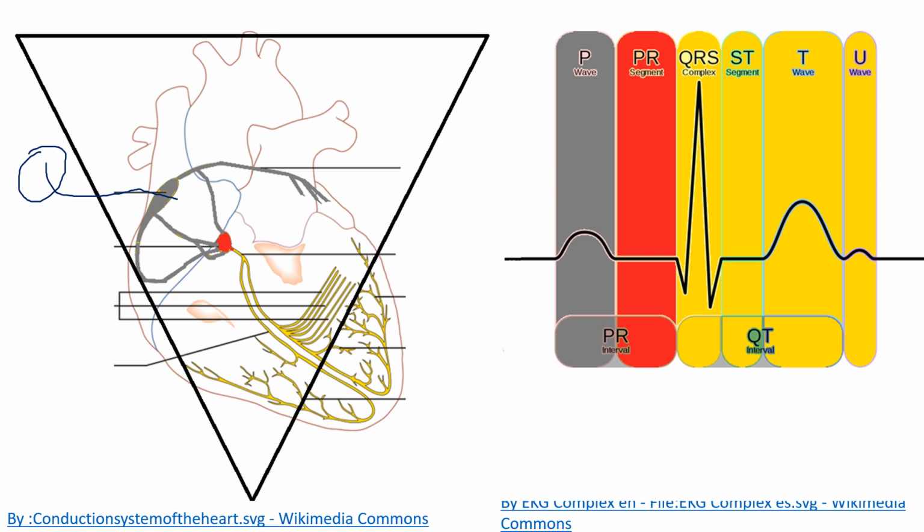Well, how do we know that you got a pacemaker? Well, we could look at your medical history, right? But aside from that, what you're going to see on your EKG is you're going to see a pacer spike. And so you're going to see this vertical line. That's the electricity coming from that pacer spike. So it's a larger amount of electricity. And then you're going to see your P wave. All right, well, I hope that helps.